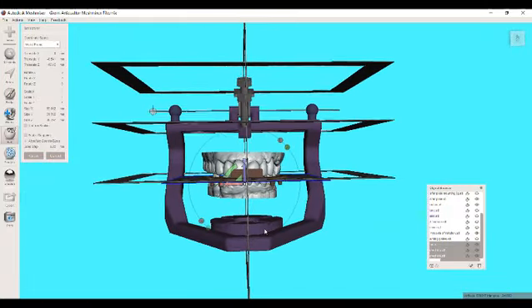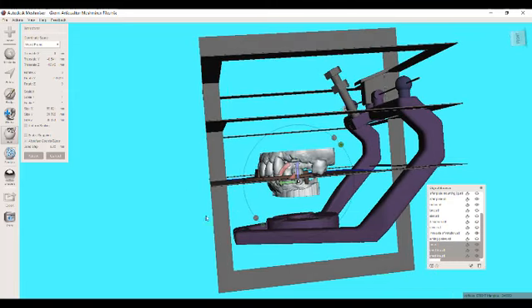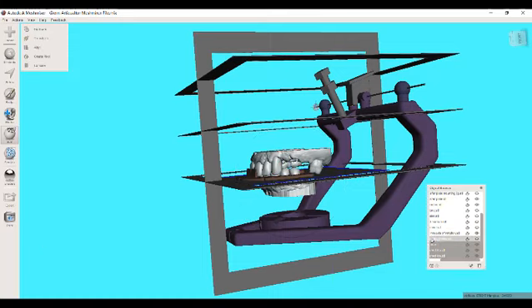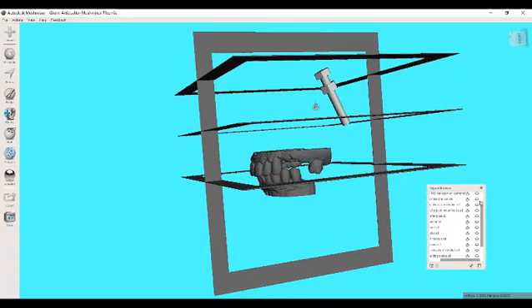Okay, you can see midline is set. I'm looking for any canting, and it does need to come up just a little bit. Okay, so that looks good. So at a minimum, even though this is somewhat of an arbitrary mounting, at least you do have the relative distance to the joint. All of this is based on the same principles as a face bow for really any semi-adjustable articulator, and so that's going to put you in approximately the right position if you actually wanted to run this through excursive movements and that kind of thing.